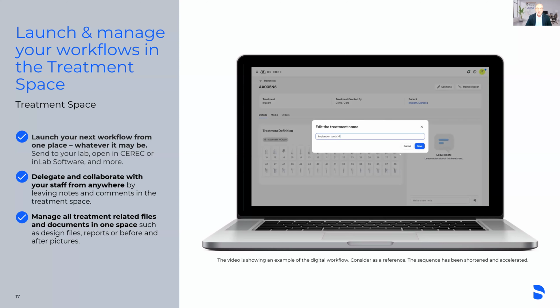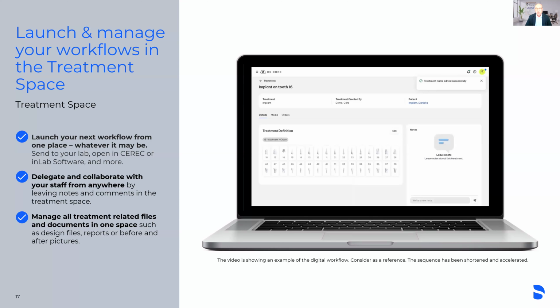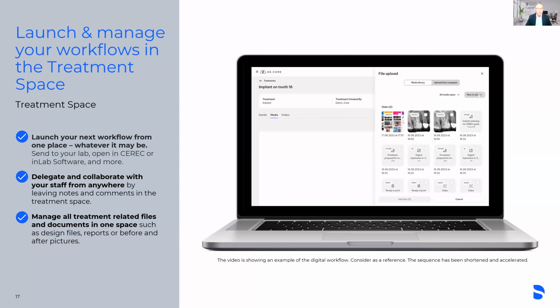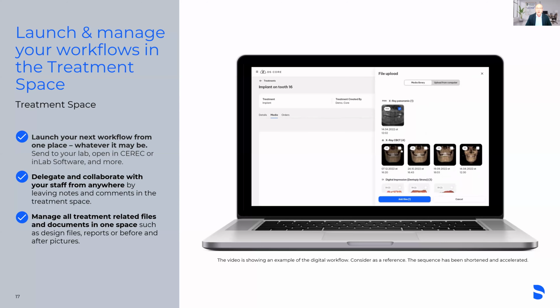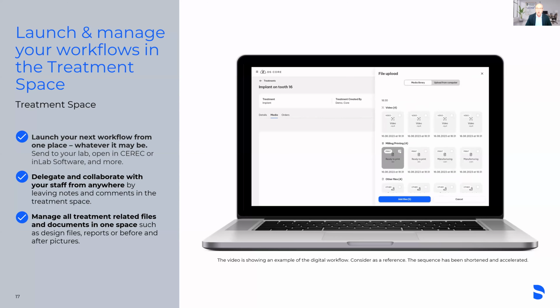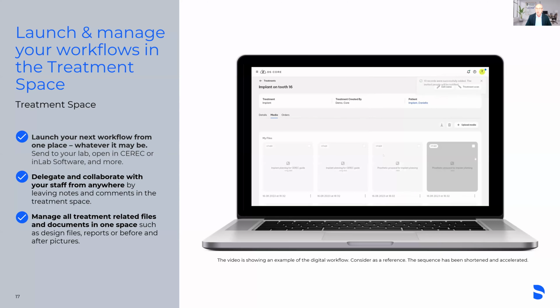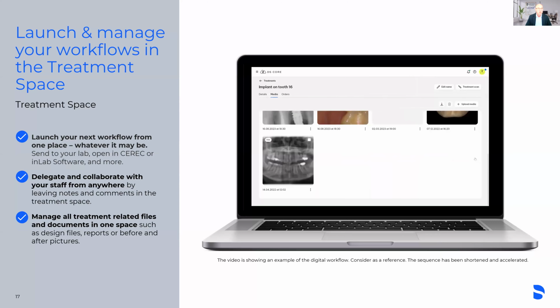And you can also delegate anything to any of your staff. So you can actually put in their notes to follow up on treatments, and that is saved in the treatment planning. So now you have a record of communication, and you can delegate tasks within the treatment within DS Core, and you can continually add files to that treatment. So you can upload more files into that treatment as you receive them. So it's really easy to manage in one space without having to go back and forth between multiple software systems.